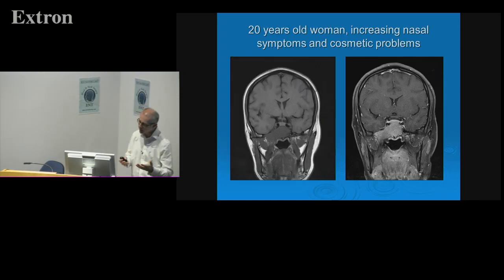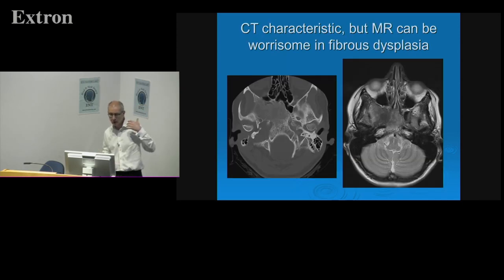Another bony issue that we can get, here's a skullbase lesion on MR. It looks like an aggressive, big, expansile tumour. But if you take nothing away from this talk other than this, it's that when you're doing skullbase, CT and MR are complementary.